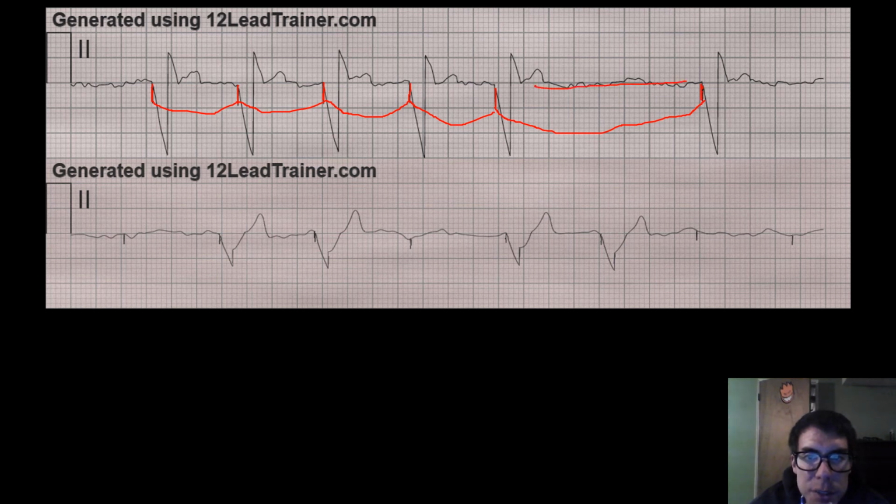But then we have this long stretch right there before this one. So in the space in here, it should have fired probably like right there, but it didn't. So that would be a ventricular pacer failure or malfunction. I would actually use the term malfunction just because there's also failure to capture, but either way. So you could call it ventricular pacer failure or malfunction.